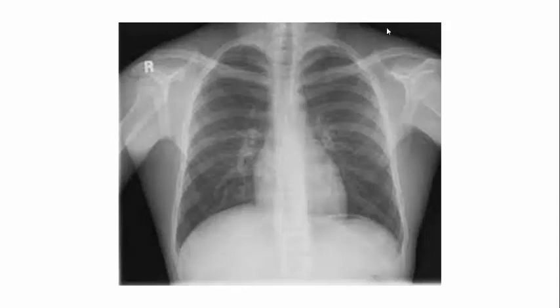And then in the X-ray you have to have an idea whether it is a sufficient or adequately taken X-ray, that is regarding the quality of the X-ray. So here it is a chest X-ray which is actually covering from the level of D1 spine to the subdiaphragmatic region, and it has covered the adequate area.